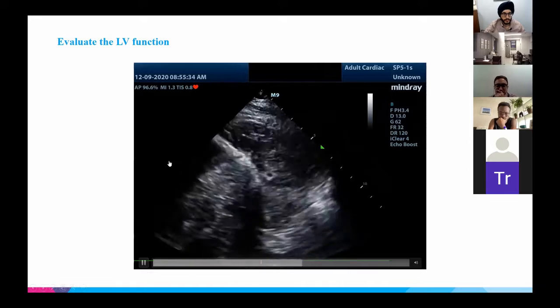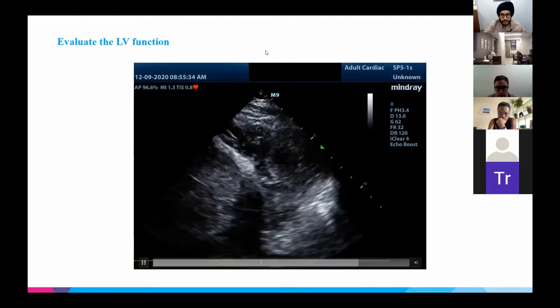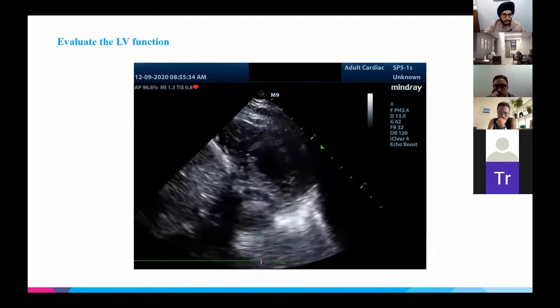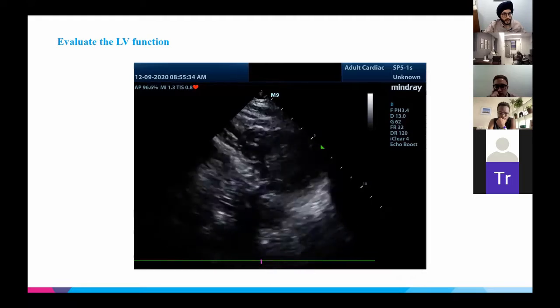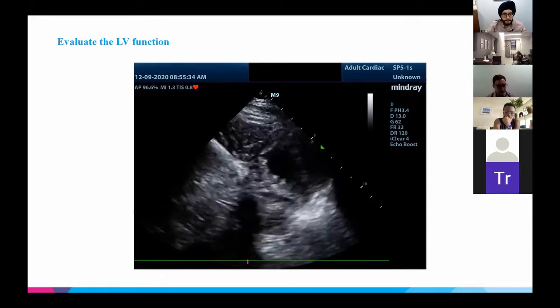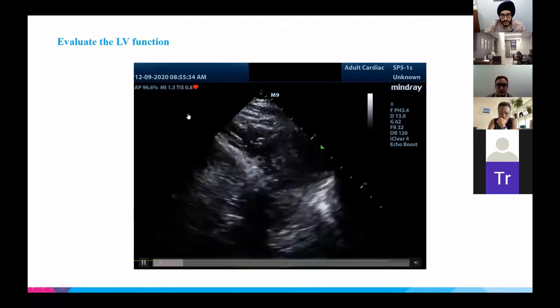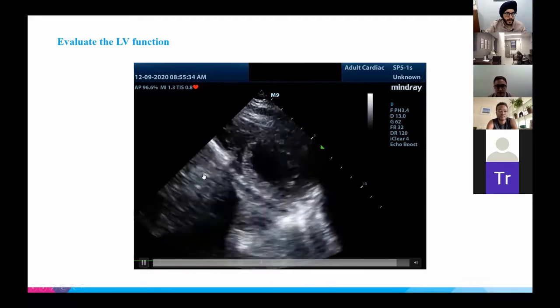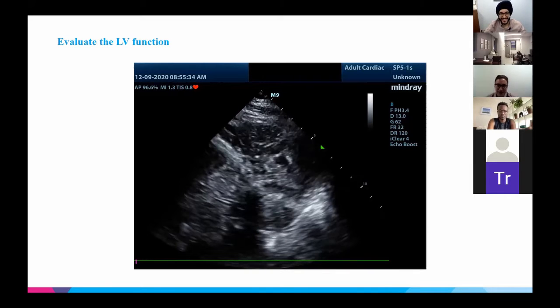What about this one? So 36 responses. Should we give it another 10, 15 seconds? Yeah. And what view is this, guys? So we have 2 responses. Fatma says parasternal short. Yep. Excellent. Good. All right. 38 responses. We can end the poll. Wow. All right. Excellent. No need to discuss this further.